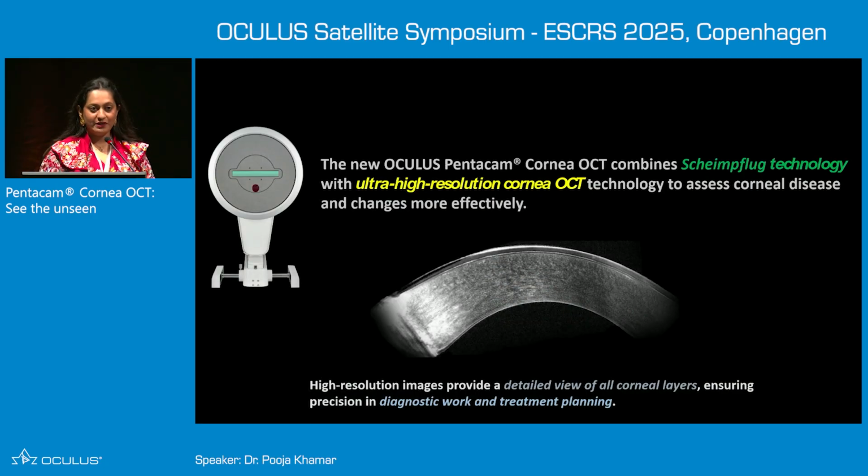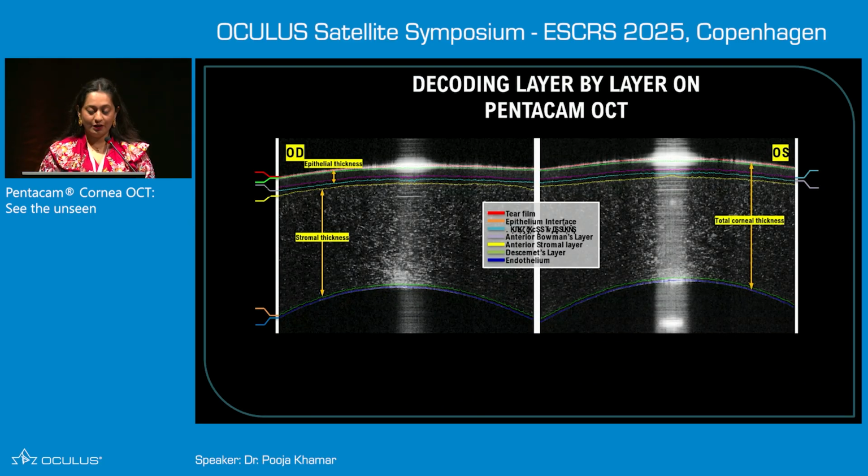As my previous speakers have already mentioned, the new Pentacam OCT combines the Scheimpflug technology with the ultra-high resolution corneal OCT technology to assess corneal diseases and changes more efficiently, which will help us in our clinics for our diagnostic work and treatment planning both. As mentioned before, the resolution of Pentacam OCT being on the superior side helps us decode layer by layer how the cornea looks.